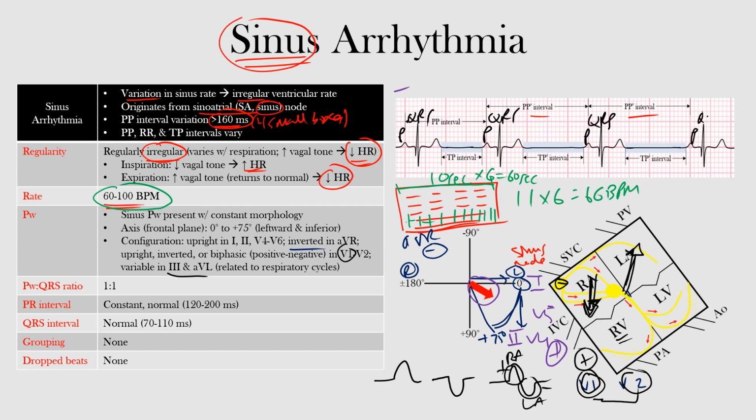And why is that? Well, our sinus node fires our P waves, and everything is getting through to the ventricles. Imagine everything below representing ventricular depolarization, our QRS complex, and above our P waves. So it's getting through, and we're seeing both happening. There's no block at the AV node or anything.